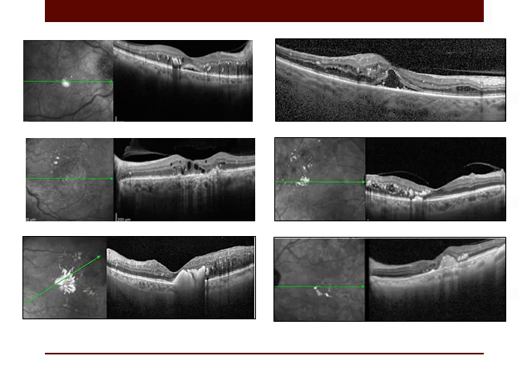Presence of hard exudation. If the hard exudate didn't change the structural integrity of the macula, like in this patient, it carries good prognosis. However, in other patients, there is change in the structural integrity of the fovea with disruption of the outer fovea, and this picture shows the presence of foveal plaques of hard exudation. The plaques mean that the outer retina has been totally disrupted and replaced with the hard exudate.